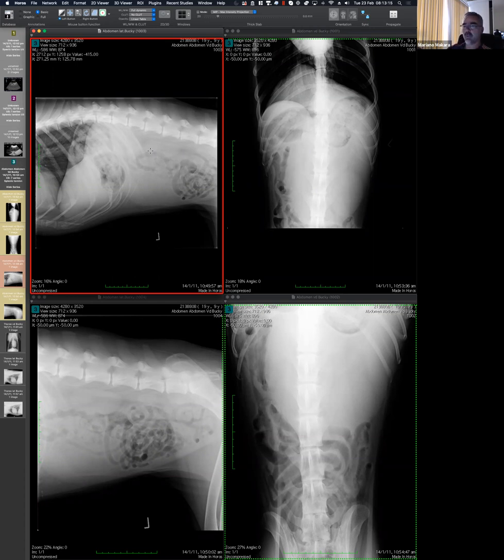And the other conclusion that we can take from that statement is that at least in the retroperitoneum, at least surrounding that left kidney, there is no fluid. Makes sense? So that's the other piece of information that we can get.